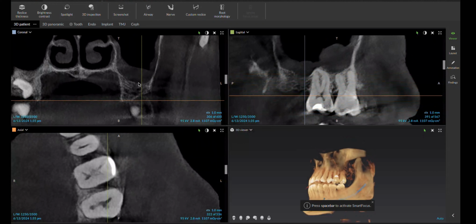Thickening in and of itself is not too uncommon. With that said, it typically means there's something going on. That's where our ENT colleagues come in very handy. Let me just start by saying we don't have bilateral thickening of the membrane, which might give us a clue this is not seasonal allergies or something more systemic in nature, but more localized. So we're starting to zero in on what the problem might be.